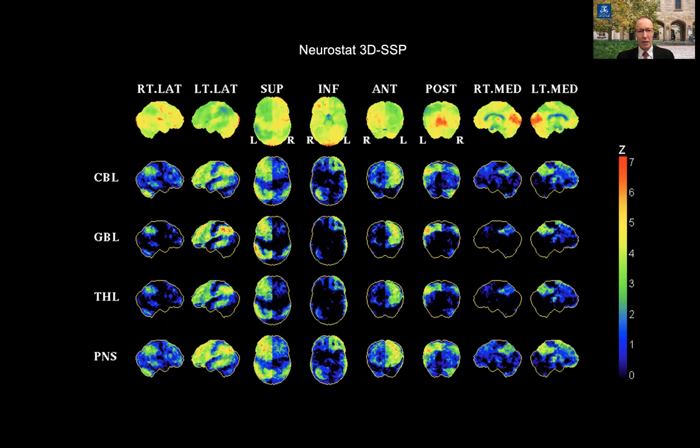So, features, yes, in some regards. There is parietal, temporal, and quite marked frontal hypometabolism, sparing sensory motor cortex, involving posterior cingulate and precuneus. It is bilateral, but it is much worse in the left hemisphere. If you look on this superior view, you can see this striking asymmetry. There is contralateral reduction in the cerebellum in the right side, opposite to the side most severely affected.